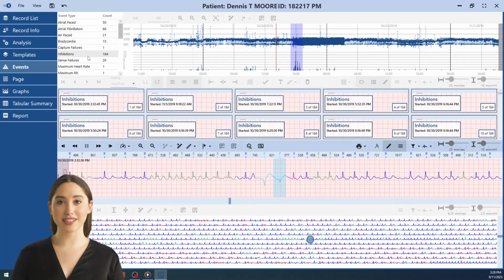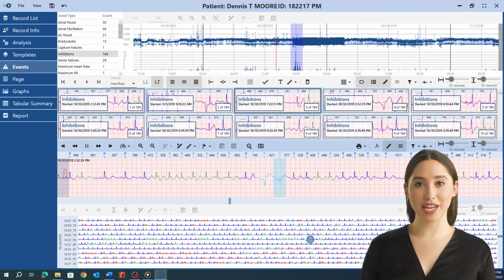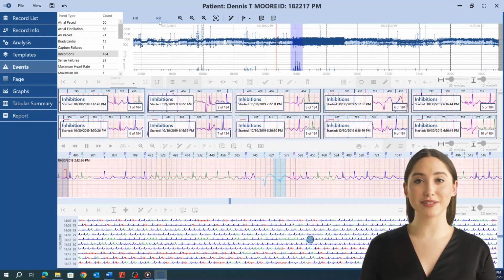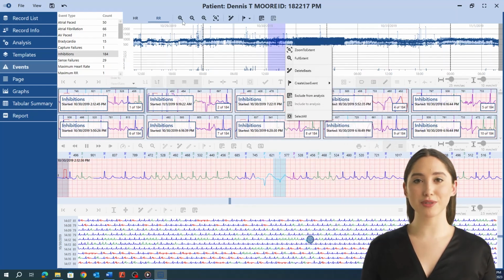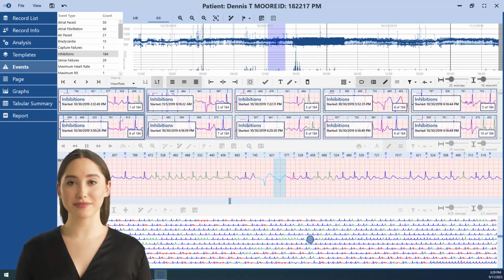Switch between arrhythmia types by clicking different events in the events list. To the right, the HR and RR buttons in the Trends view display heart rate or RR interval trends. Select trend segments by right-clicking and dragging. Then manage beats, add events, or exclude noisy segments via the context menu or toolbar. The histogram below the Trends view indicates the frequency of the selected arrhythmia type. You can edit it like the trends above.